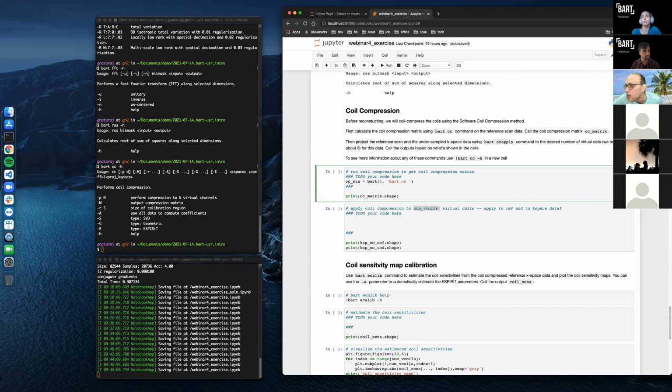Well, so then we want dash capital M, I'm guessing. That's right. And I guess we need an option. Let's go with dash capital S for SVD. Okay. I don't know if we need anything else but an input. That's right. What is that input?